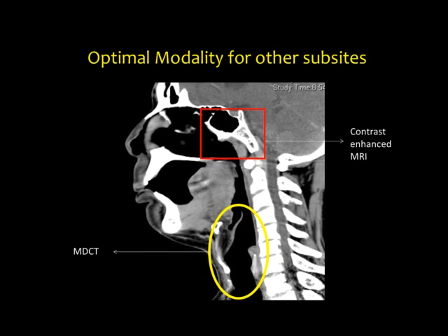For the skull base, again, I would say CT and MR both are complementary. So you see that you've done a comprehensive imaging. When you are looking at the foramens, you've seen the widening, the subtle destruction, subtle erosions of the cortices along the clivus, along the foramens. You've picked it up on CT, but to make a definitive diagnosis of perineural spread or extension into the intracranial cavity, you must and must advocate an MRI. There's no harm in asking for an additional imaging when you are not sure. So always ask for an additional imaging when you are not sure, especially when the plan is going to change from resectable disease at the foramen ovale to unresectable disease when it goes into the cavernous sinus.